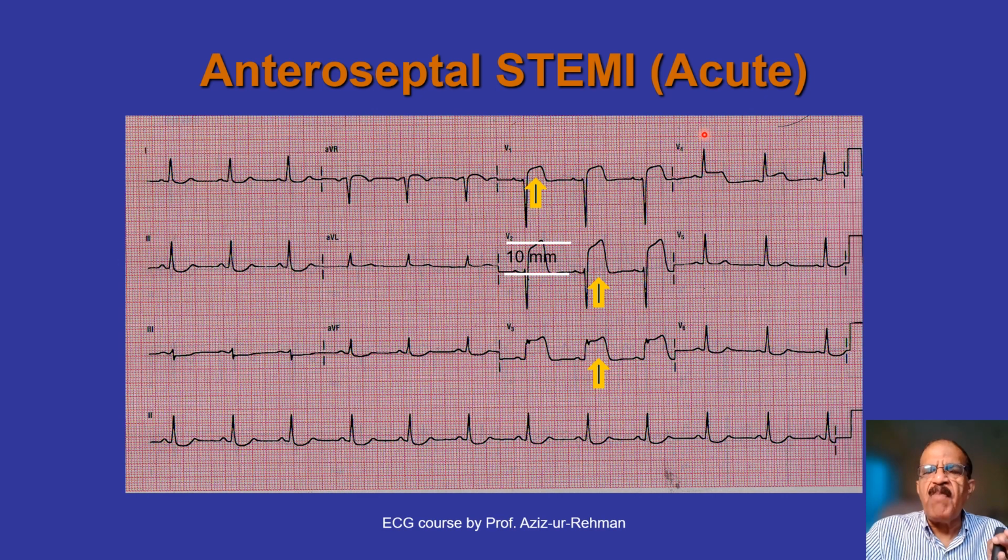Theoretically, we cannot say myocardial infarction unless we demonstrate that this patient has troponins elevated also, because these changes may be reversible. If changes reverse with intervention or spontaneously, then technically the patient did not develop myocardial infarction, right? So myocardial infarction would be diagnosed when we have Q waves or when we have documented elevated troponins. So at this level, we would call it acute coronary syndrome. Very likely to go into infarction, but technically this is acute coronary syndrome of ST segment elevation type.